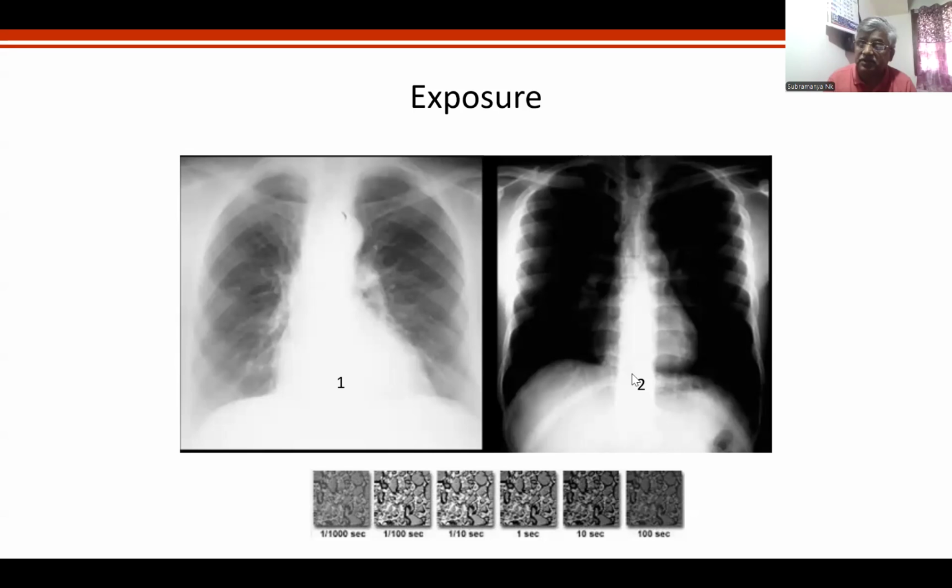The spine appears very, very prominent. And here, there is less load of X-ray because of shortest duration of time. So everything becomes opaque because the dose of the X-ray that is offered is too less because of reduced exposure, and that X-ray gets obliterated onto a film, and therefore you see more whiteness.